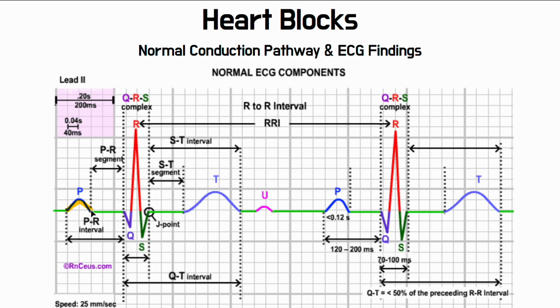First we will talk about the waves. The QRS complex indicates ventricular depolarization, and this T wave indicates ventricular repolarization. There can also be a U wave. A U wave can be present sometimes, not always. Why that happens is because sometimes the papillary muscle shows electrical activity, right? So in those cases a U wave can appear. You should not get confused over that, right?